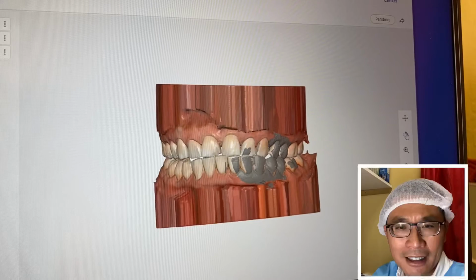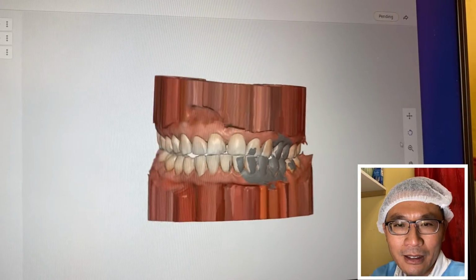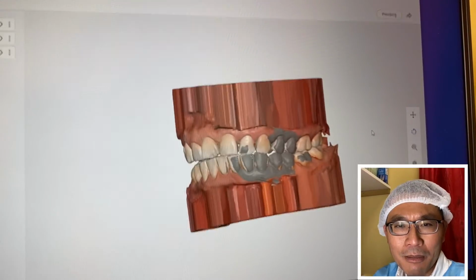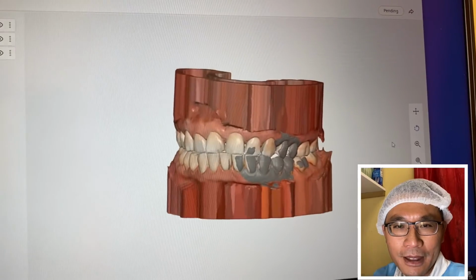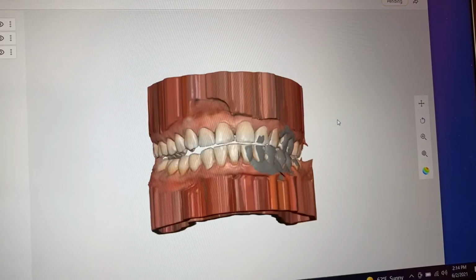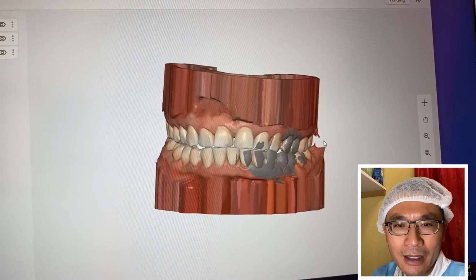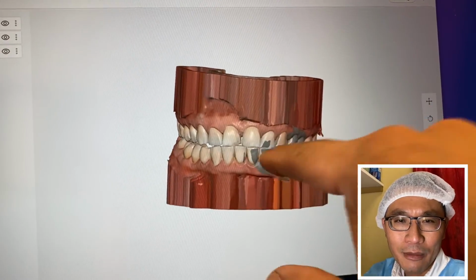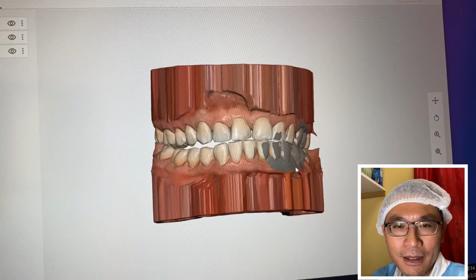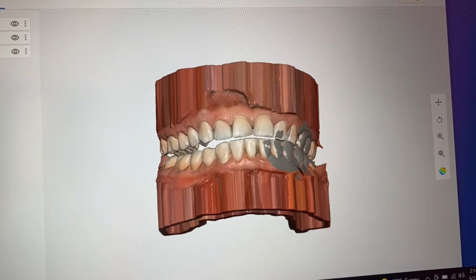With the problem I mentioned before, the upper arch having some space issue and some point contact issue of the posterior teeth, we can create more room, close these gaps, and extrude 7, 8, 9, 10 down and backward a little bit. You're going to see a great outcome with the braces established and finished for the patient.